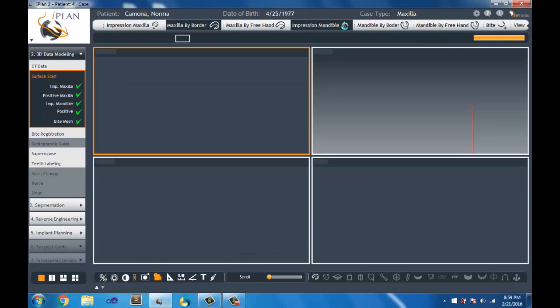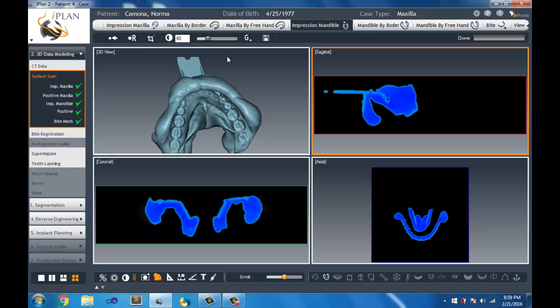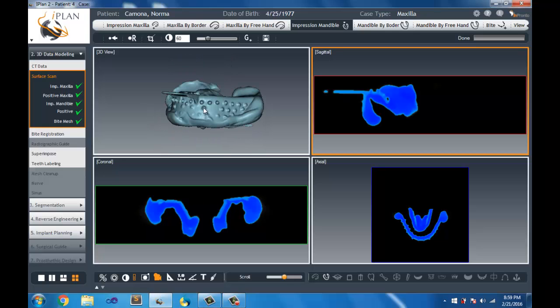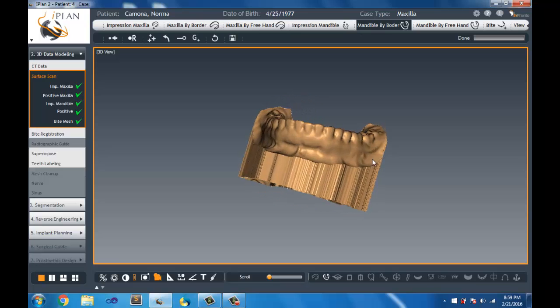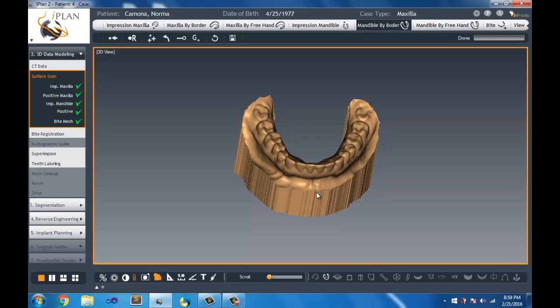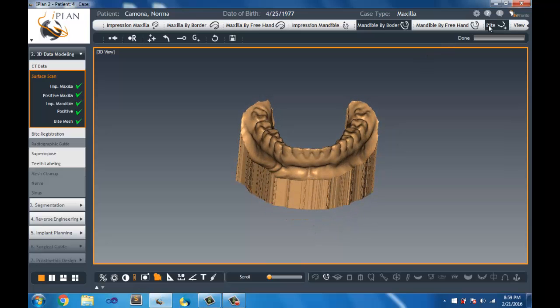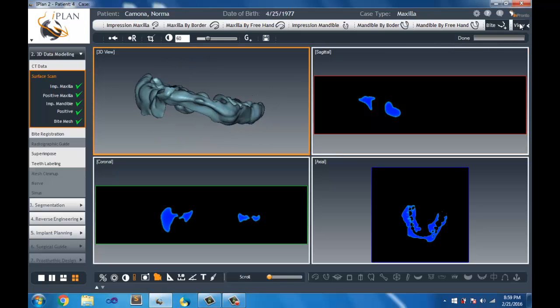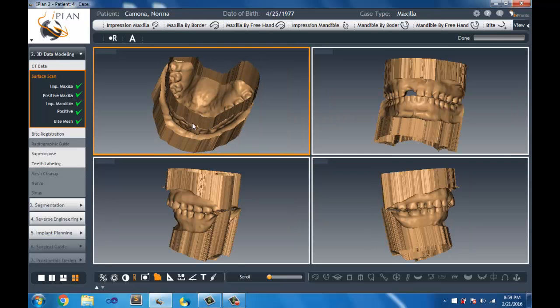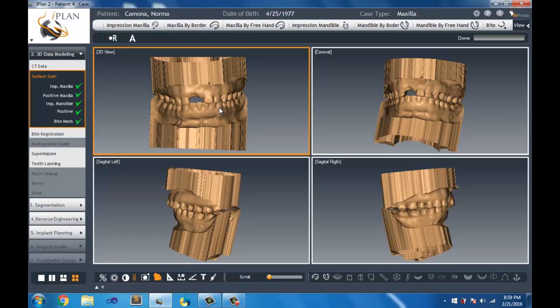Same thing is going to happen to the lower full arch PVS impression. Same thing, we will digitize it from the negative, which is the actual impression. We will turn it into a positive. We will put a base to it so we can actually print these models and articulate them. And then, of course, to articulate it, we also scan the impression, digitize the impression as well, and from the analysis of the digitization of the bite, we can look at the 3D analysis of the occlusal space.